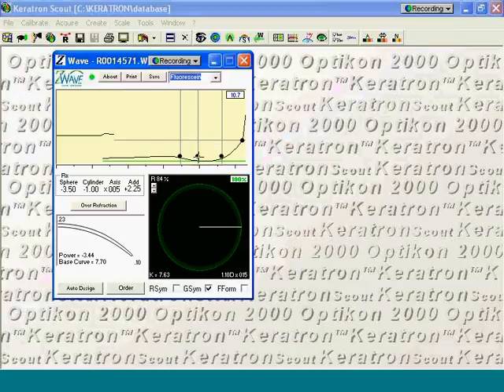We can do the same thing with the tear layer control points. For instance, if I want to raise the edge lift on this lens all the way around, I can simply get this control point for the bevel position and hold the left mouse button down and pull it to the right. Now, if I go far enough to the right, it will be prevented by maximum. But you can see I was able to lift the edge all the way around the lens with that control point.